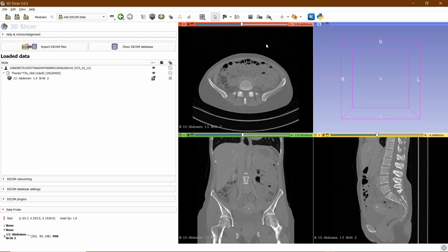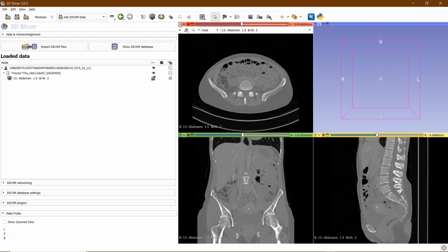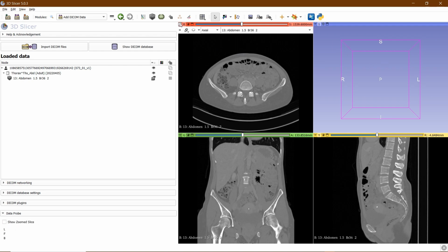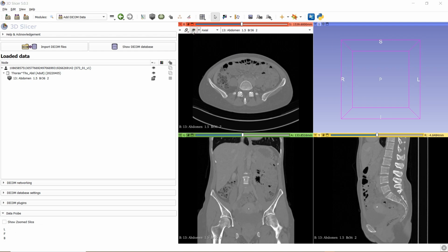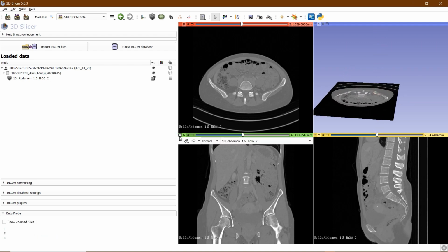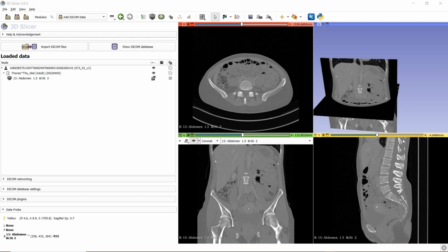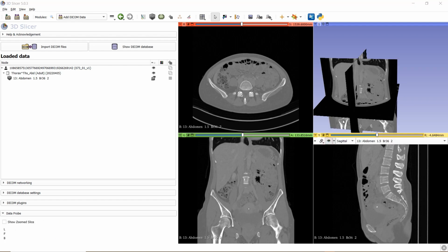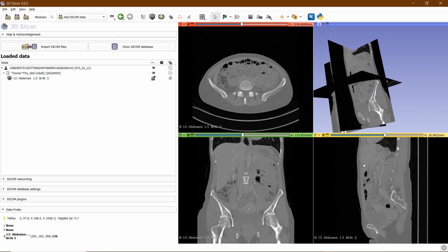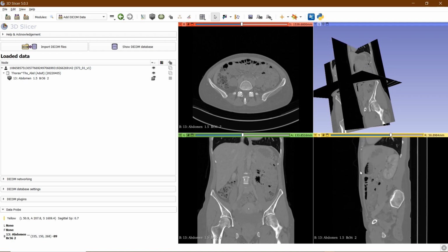It's also possible to show all of the planes in the 3D view by moving the mouse to this little pin in the left top corner and then activating this eye symbol. When we check the three-dimensional view, we can see our transversal plane there now, and activate also all of the other reconstruction planes to get a first impression of the three-dimensional appearance of our anatomy.